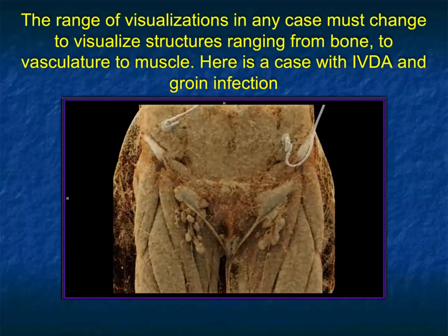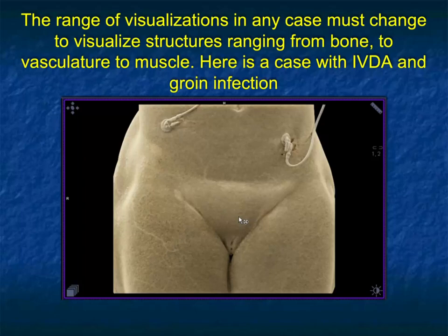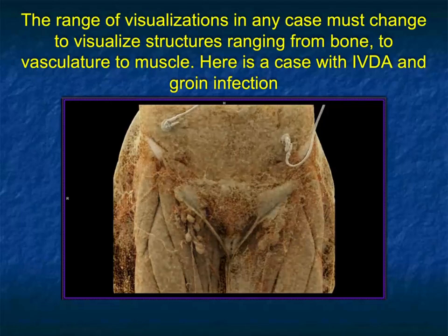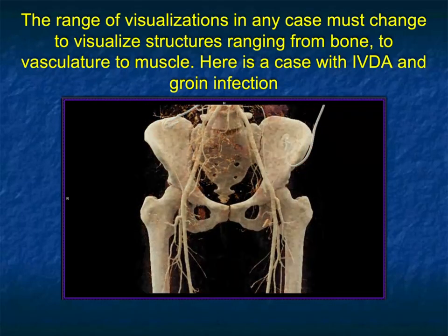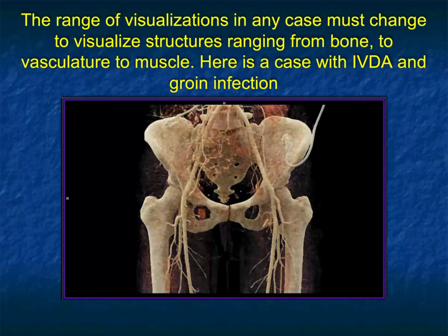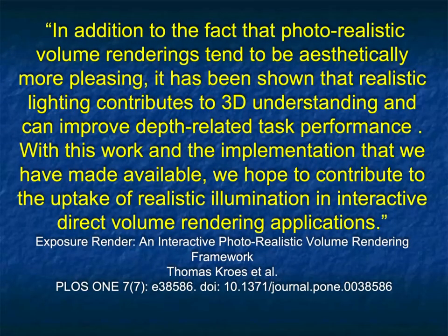So the ability to use cinematic rendering when done correctly, I won't say it's a virtual autopsy, but it's virtual analysis of all of the patient's soft tissues and bone and any pathology present. And again, just think about that. Imagine if you were reading every CT like that. The question is, can we develop tools that allow us to look at the volume of CT and in real time be able to do this? Now, we can do it now, and we do it, but the question I always had is, can we integrate that into practice so it's a standard of care about how we look at information? That's not quite there yet, and it may take some time, but it's definitely doable.